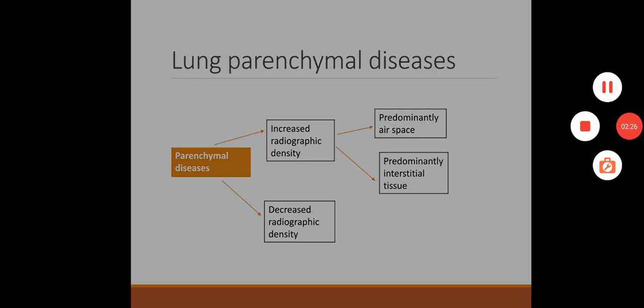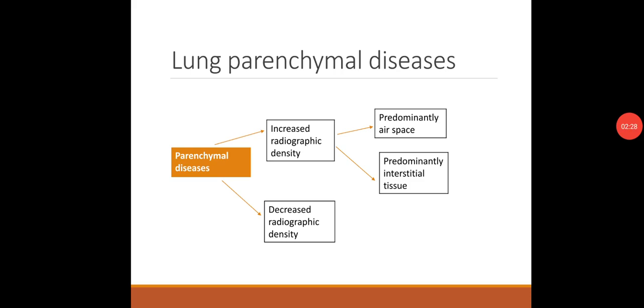Lung parenchymal disease. The parenchymal diseases can be radiologically classified as either those which show increased radiographic density or those which show decreased radiographic density.